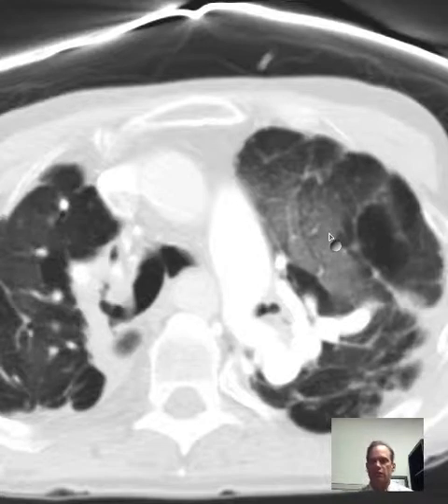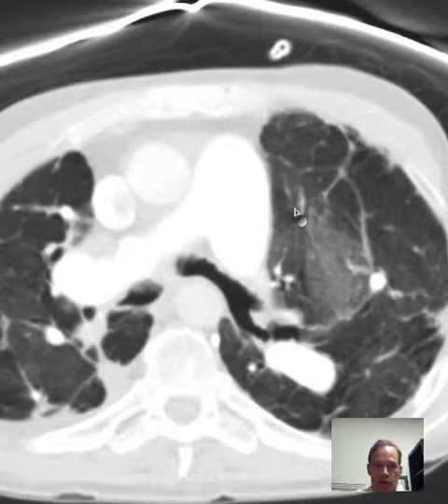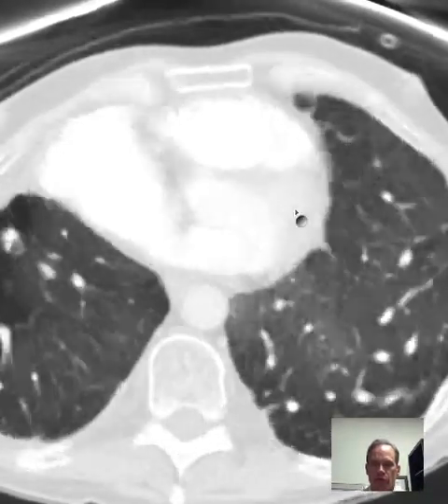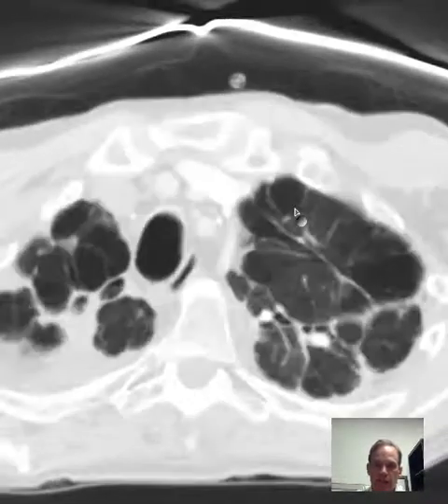In case you don't know what ground glass actually means, it's something that they would put, for example, on the glass of a shower enclosure so that it allows light through, but it's actually ground, like with some type of metal or rock that gives it such a very uniform but scratched up texture that you can't see through it in detail, but it allows some light through. So that's what is meant by ground glass. So there are ground glass opacities. What else? So we have emphysematous bullae, ground glass opacities, and look up here.